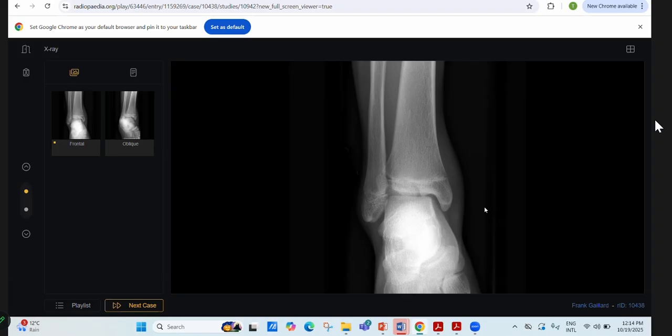Type 1 is just the slipped physis. In type 2 the fracture line passes above the physeal line. Is it above the physis? Below. Then you mentioned it is type 2? Yes, it is below. Then what is this, not crossing the physeal line? Then what is it? Type 3.